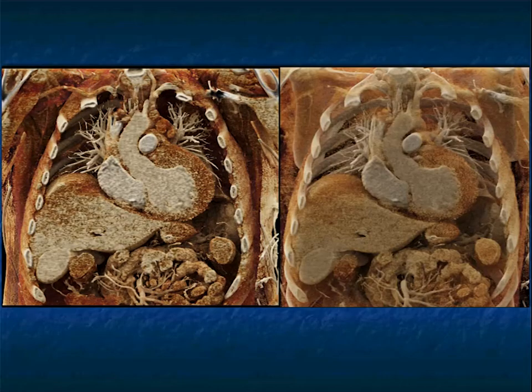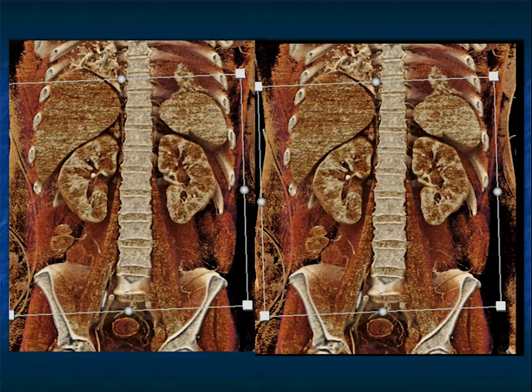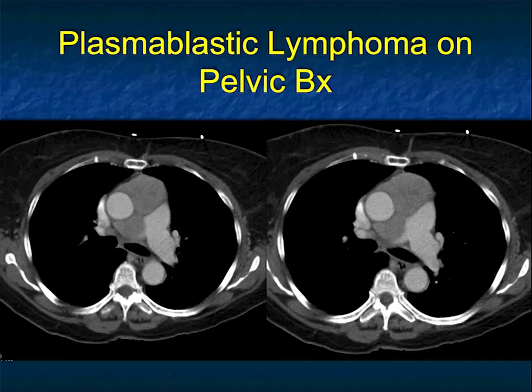of the adrenal glands, as we saw a moment ago, very nicely seen. And again, the infiltration of the kidneys. So multi-organ involvement is one of the common things when you have cardiac lymphoma. And I love the kidneys on the cinematic. Really shows you the textural change due to tumor infiltration.